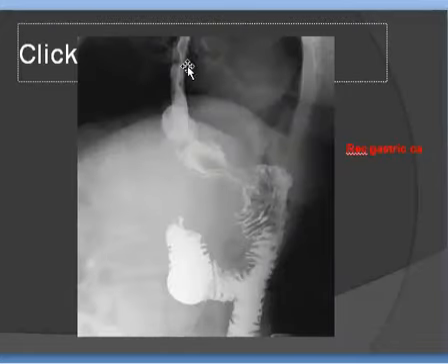This is the esophagus. This is a pouch of the fundus, and this is part of the body, and there is a large irregular thickening here of the outline, converting the remaining part of the pylorus into a very narrow lumen reaching the jejunum. Gastrojejunostomy with gastric carcinoma at the site.